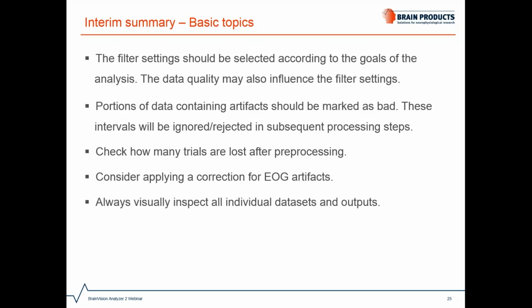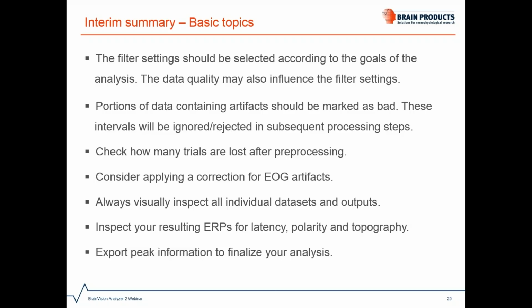Always visually inspect all individual data sets and outputs. I know Analyzer does a lot of things automatically if you want to, so it's rather easy to ignore the data sets, but my recommendation is always check it visually, because then there are no bad surprises later. Inspect the resulting ERPs for latency, polarity, and topography, and export your measures of interest like peak information to finalize your results.